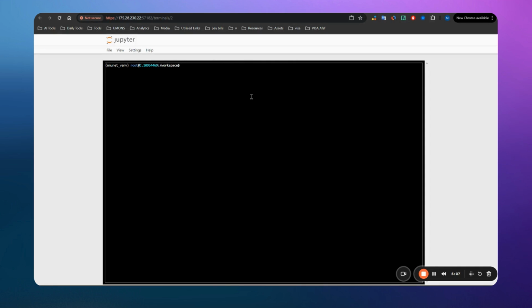Now, what we can do is start the pre-process and the training. This is almost done. Whenever we launch the pre-process, it will take some time, so we will just run it and wait until it completes. Then after that, we'll run the training command and wait until it completes. Okay, so let's start with the pre-process.